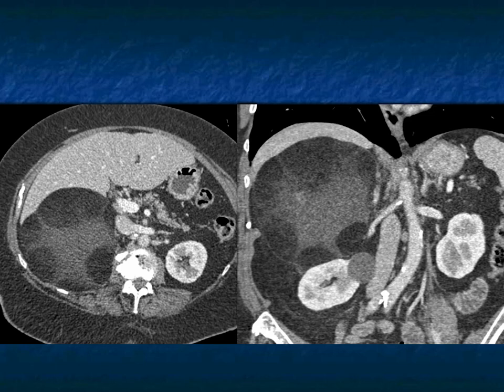Myelolipomas are one of the causes of spontaneous adrenal bleed. Typically over 5 centimeters, they will be resected. Patients can present with flank pain simulating renal disease, simulating liver or gallbladder disease because they bleed. And this high-density zone is an area of prior bleeding. There's no active bleeding going on at this moment, but this is prior bleeding. So just a really, really nice example of that.